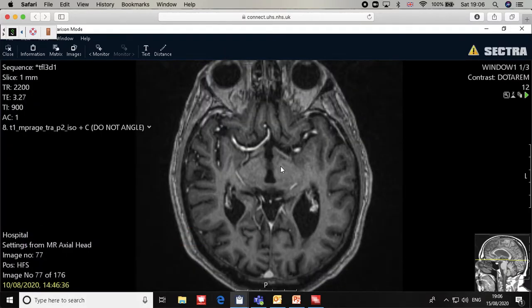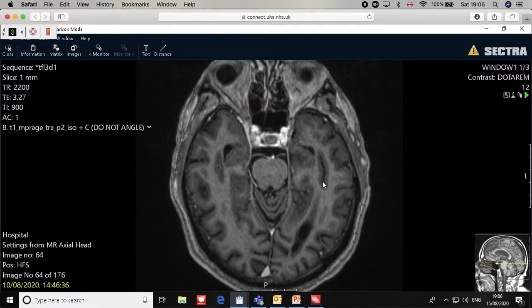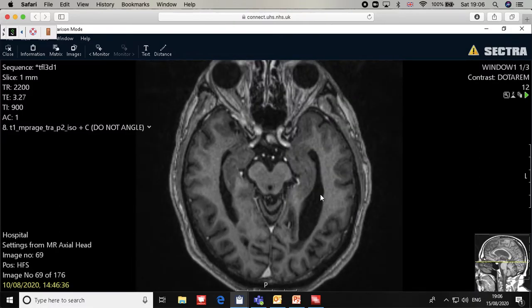And the last structure we can do today is the brachial plexus. Oh, we forgot the brachial plexus. Oh, that's more than 1 hour now. I don't know if we can upload all this together. Let's do the hippocampus together quickly, and then we can go for the brachial plexus also quickly.